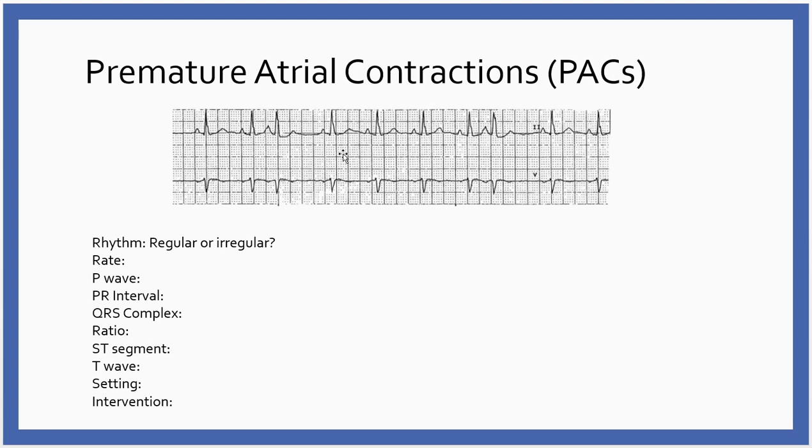So what do I have here? I have sinus rhythm, heart rate in the 70s with PACs, okay? All right, setting on PACs, and as I said, this is a common ectopy. I would bet almost any amount of money all of you have had PACs at one time or another. It can be associated with coronary and valvular heart disease. Digitalis toxicity, by the way, is associated with any dysrhythmia known to man.